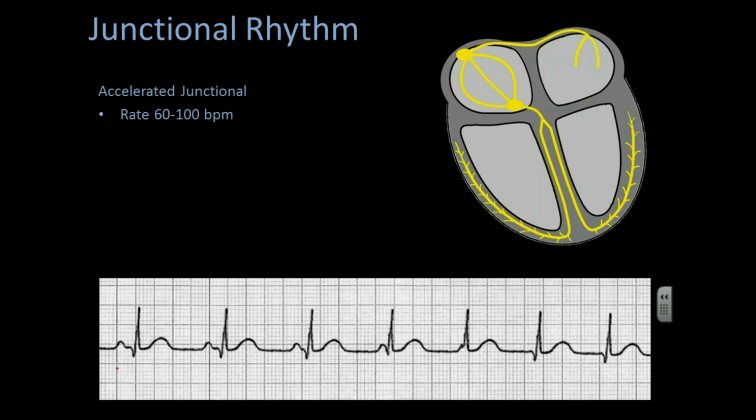Now, I can see the patient is in sinus rhythm. Looks like they have upright P waves. But one thing that you notice about this is the PR is getting smaller, until it is almost not even visible anymore, and then it completely disappears.